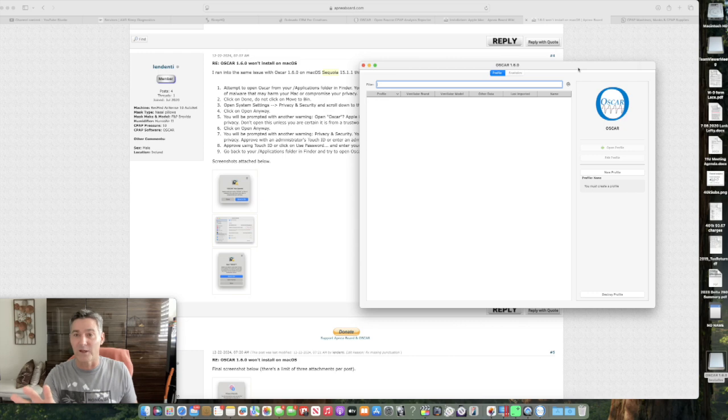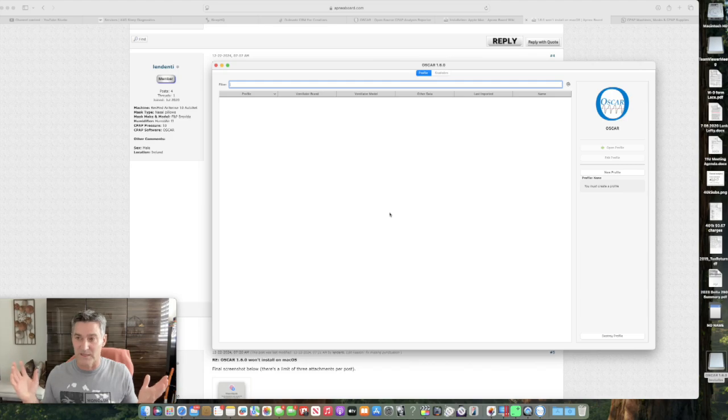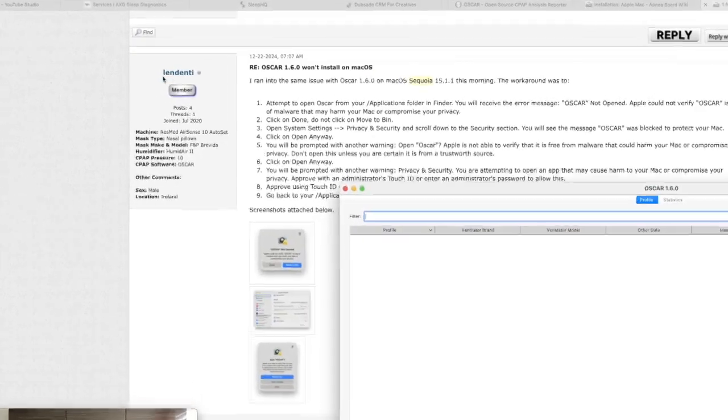And then it'll finally open up. You'll get this screen. So that was it. If you've been having a hard time with it, that was it. So I do want to say a huge thank you to Lendenti.